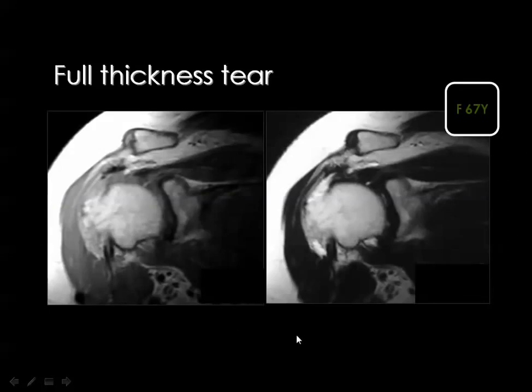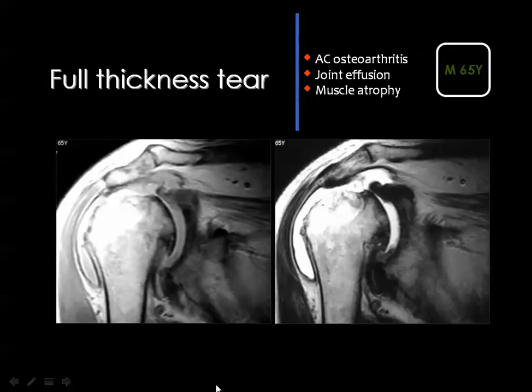Then this is the full thickness tear. You can see the cut edge of the tendon. Here is the cut edge of the tendon, and this is the gap to the greater tuberosity. The gap is about 2 centimeters, and the muscle is more or less intact. Then this is also a full thickness tear. You see the cut edge of the tendon and the retraction of the muscle, and there is very big gap between the cut edge and the insertion site.